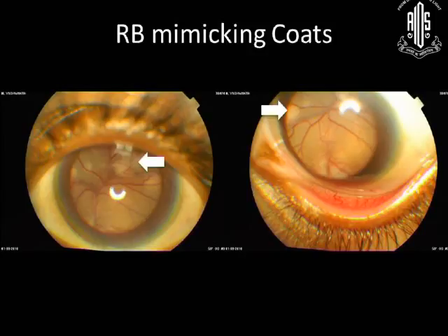So retinoblastoma involves the retina. Coats disease does not involve the retina in the form of a mass lesion. The vasculature is there, but all the exudates, the white stuff you see, is under the retina in Coats disease. But if you see carefully, this looks like Coats disease, the total exudate with retinal detachment, retina just behind the lens. But if you note carefully, this white lesion is within the retina, full thickness retina is involved. So when there is a full thickness retinal involvement, it's most likely to be retinoblastoma.